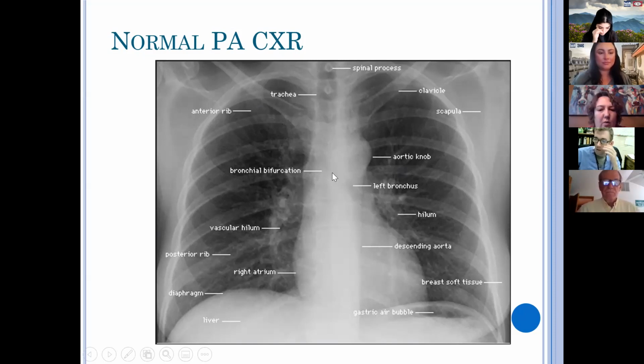When you are looking, you can see that this dark strip here is the trachea, the windpipe, and when you get down here to the carina, it branches into the left and the right, and you can see this black outline continues down. You get into the hilum here, and you can see all the vasculature here.